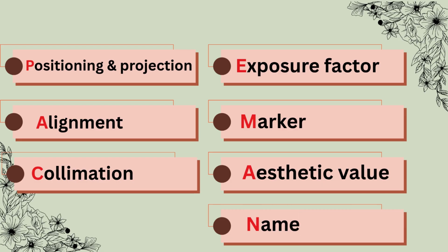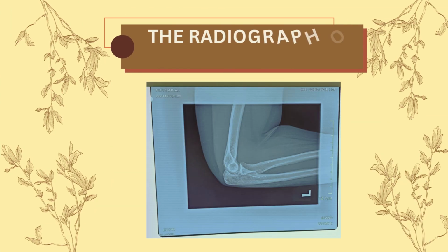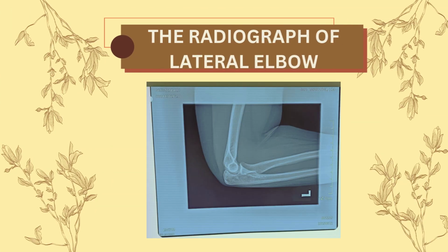And the last one is N. N stands for name. Is the ID correct? Does the image correctly identify the patient? Also, name is mandatory for every radiograph. The last part of this session is that we will critique the radiograph of a lateral elbow. This is the radiograph that we will critique with the PACMAN method.